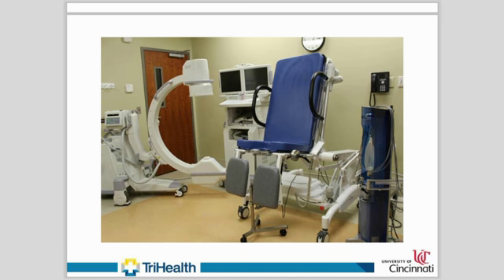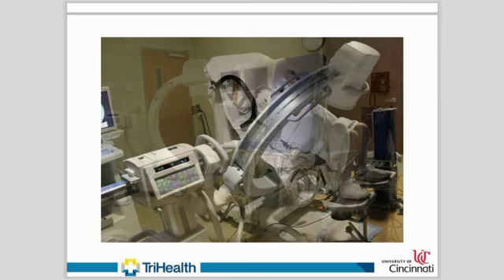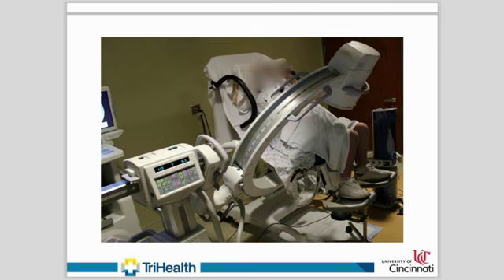A fluoroscopy machine, preferably a C-arm, and a fluoroscopy-compatible urodynamics chair are required. Staff must be trained in the use of fluoroscopy, wear lead shielding, and use monitors to track radiation exposure. Proper fluoroscopy techniques to minimize radiation exposure must be employed. Testing is typically performed in the sitting position, however, there may be indications for other positions such as supine or standing. Average fluoroscopy time is less than 15 seconds.